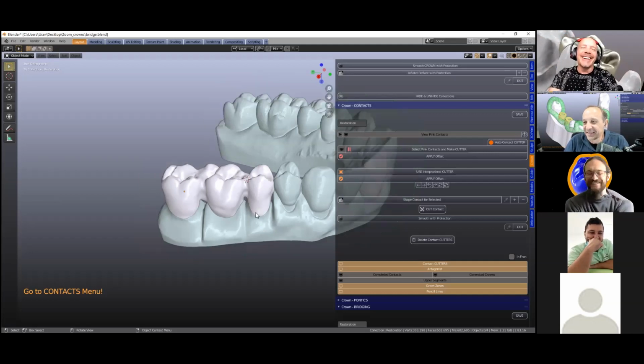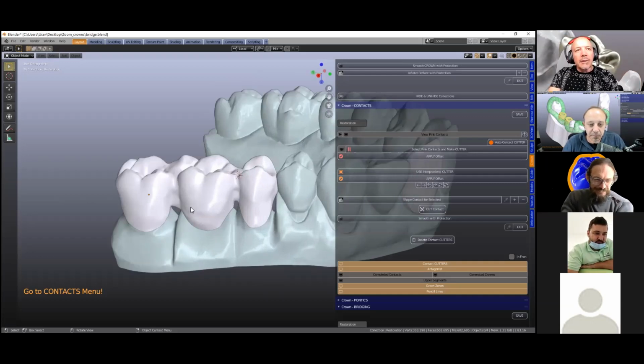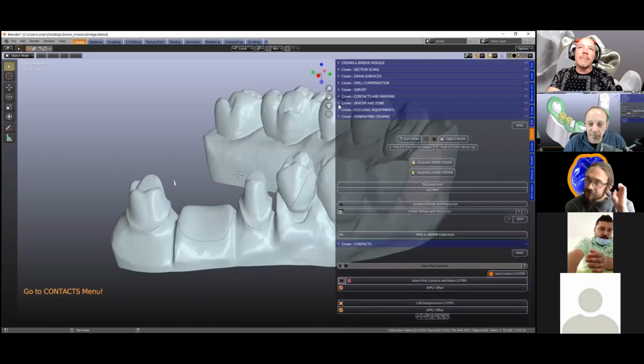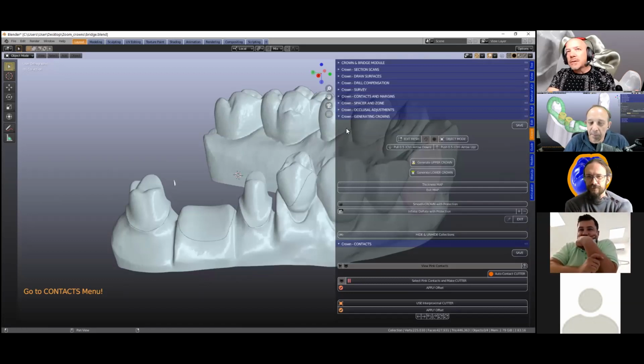Yeah, yeah. So anyway, so we've got a bridge, okay? Now I'll just delete this bridge. And now you've got instructions. Okay, you don't want to have a bridge, you want copings instead. Now, what on earth do we do? Okay, so that's quite easy, because what we're going to do is we're going to go back to our midway point, which is the zones. So we need to expose our zones. Okay, so let's just go and look for our zone.